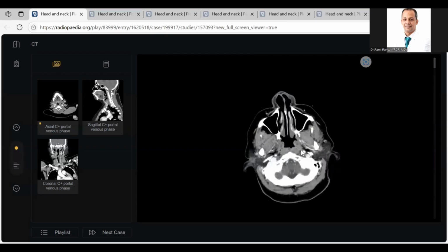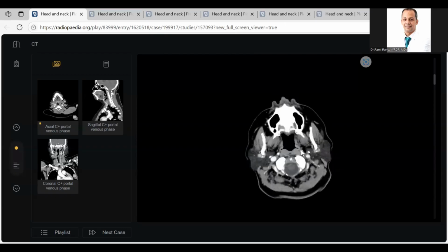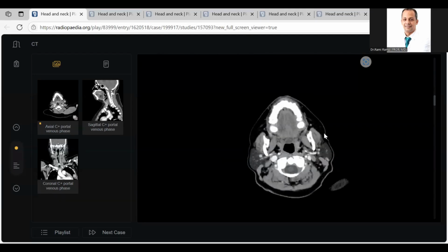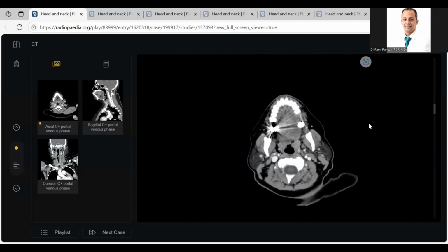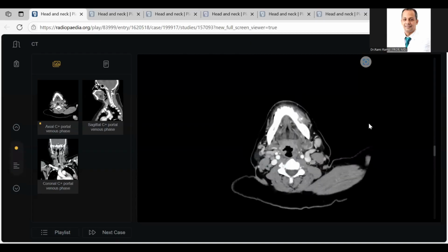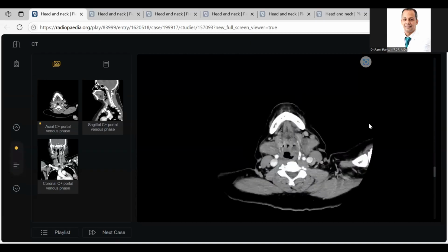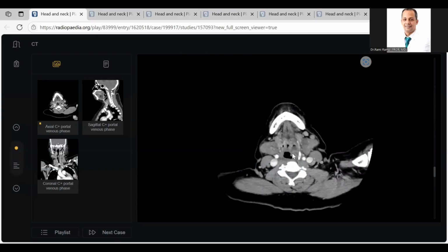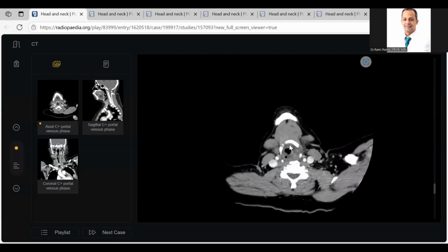Okay, begin from here. This is the nasopharynx. Then down, after starting the level of the palate, we are in the oropharynx. This is the base of tongue, down, down. After the base of tongue, nearly just at the base, there is something here. At least tell me, doctor, this is between the oropharynx and the laryngeal region.